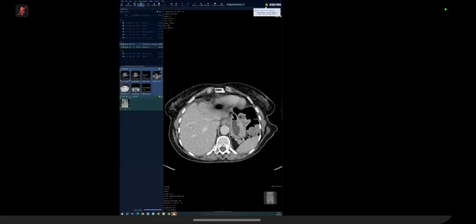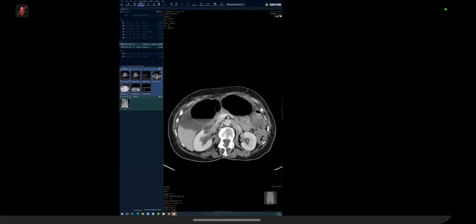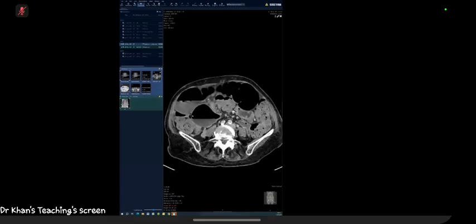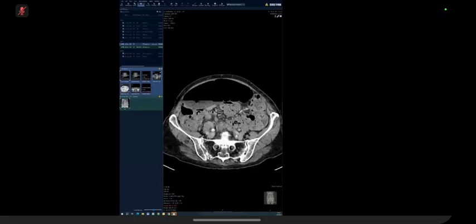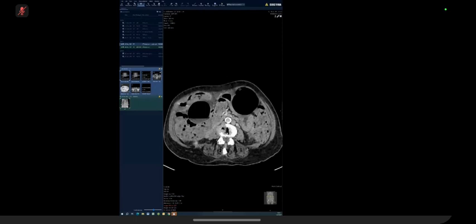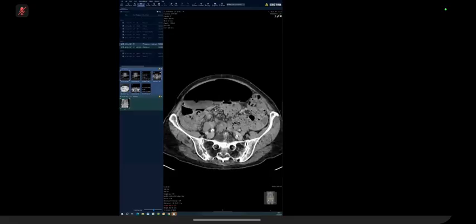Okay. So I would ask again that you follow the rectum up. This is the descending going up, ascending going down. So the transverse. So all this feces-filled is the large bowel, and then there's this dilated loop that goes all the way up, turns on itself, goes all the way down. But does that confirm your sigmoid volvulus? I just want to see the coronal to confirm.